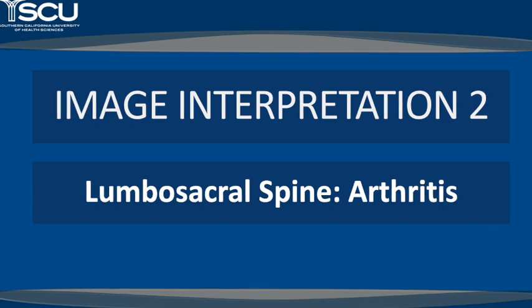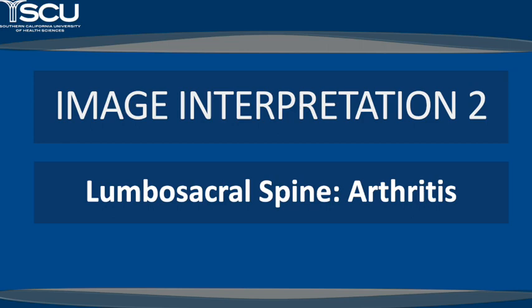Moving on to our next case, we have a 38-year-old female presenting with low back pain for several months. This clinical scenario raises suspicion for osteitis condensans ilii, an isolated sacroiliac arthropathy with a controversial origin. Osteitis condensans ilii predominantly affects multiparous women between the ages of 20 and 40, with a female-to-male ratio of 9 to 1. These patients typically have positive orthopedic sacroiliac joint tests and experience pain that resolves quickly after adjustments.